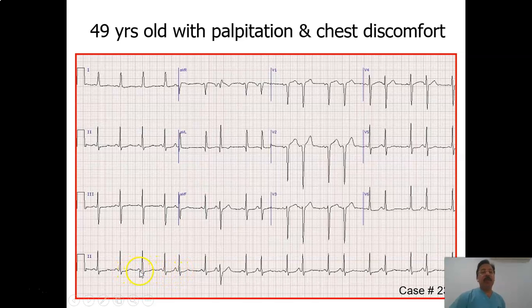but if you notice, there are P waves followed by the QRS complex, and this is again P wave with QRS complex, P wave with QRS complex. But if you see the P waves, two different shapes of the P wave. One is small, one is large. So it means there are two sources. One probably is the sinus, and other is ectopic.